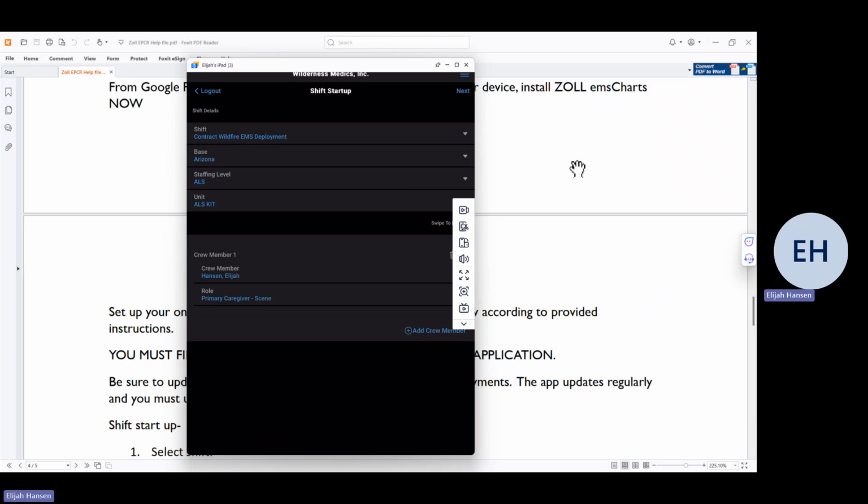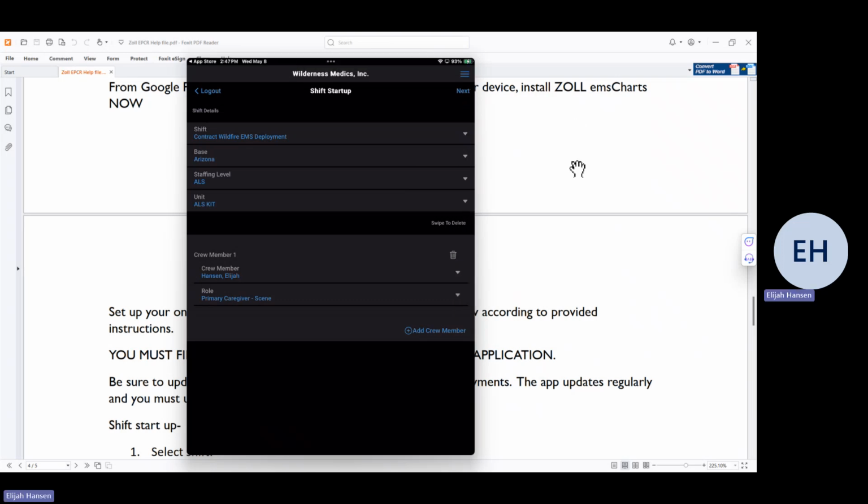Okay, so once you got that done, and you could do this on the plane going there, or after you check into the fire but before you go on shift, you can just get all this set up and go ahead and close the app from there. That information is going to be stored until such a time as you're possibly at drop point alpha, just hanging out and waiting for something to happen, and something happens, you get a call.